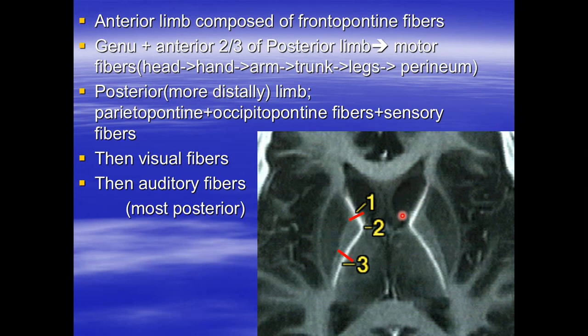You can see that the head of the caudate nucleus is connected to the lentiform nucleus by tiny striations, forming what's called the corpus striatum. And you can see this whitish thing here. This is the internal capsule, composed of an anterior limb, genu, and posterior limb, and these are fibers going from the cerebral cortex to the rest of the central nervous system.